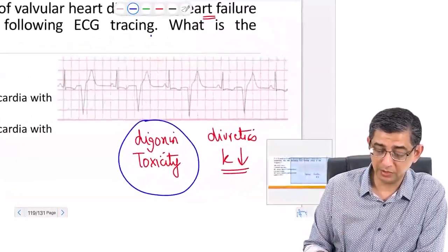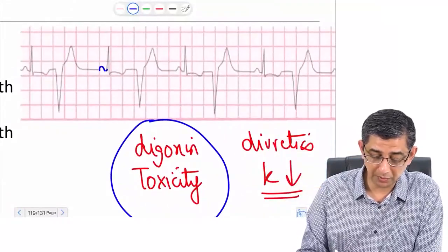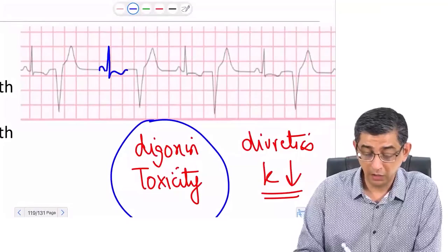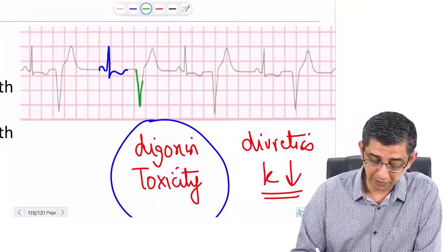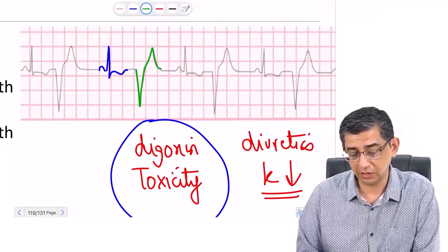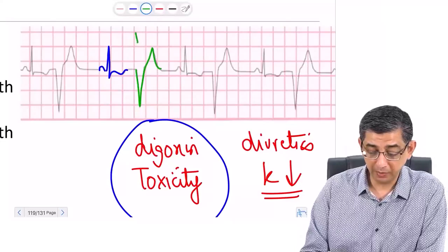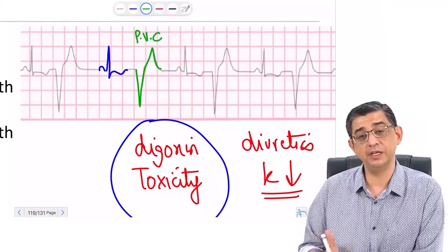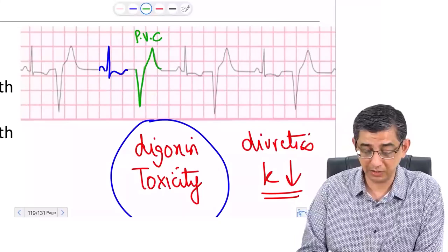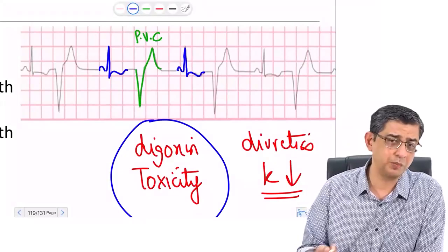And now let's look at the ECG of this person. I'll just zoom it for your convenience. You will notice a very characteristic P wave present, then a QRS complex with a slight T wave inversion, after which you notice a really broad QRS complex, this that I've highlighted before you, which I can call a QR complex as well, is a premature ventricular contraction. The ventricle is getting depolarized early and then contracting also early, though it will be an ineffective contraction.